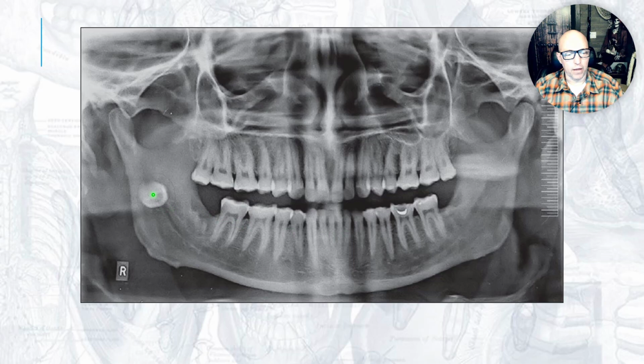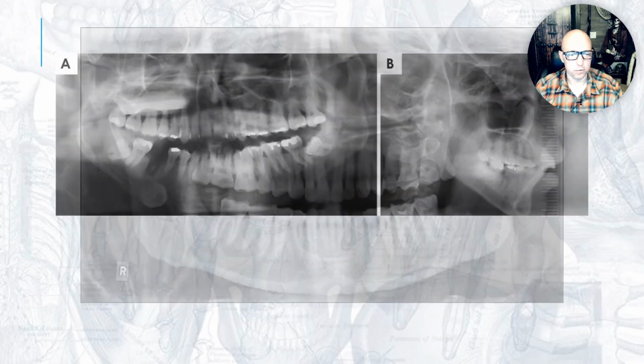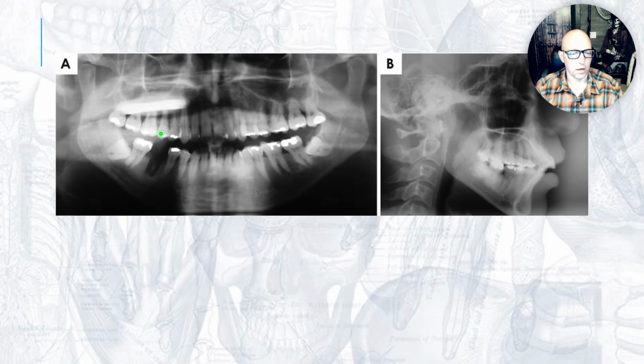And I used to talk about that as, yeah, it's probably more likely to be toward the lingual, but seeing as we see a ghost image of the entire mandible, and this is pretty close to the mandible, which it should be, it could be buccal or lingual, and I'm not really sure. You know, depending on how they did their incision, it's more than likely going to be toward the lingual. So maybe a better example is this next one. Looking at a ghost image here.